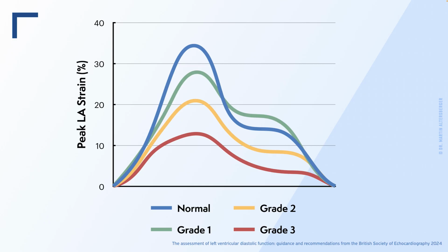So if the left atrial strain, the reservoir phase will be reduced, also the contraction phase will be reduced. The conduit strain for me has less relevant clinical meaning. So in my report, I mostly talk about the left atrial strain, reservoir phase and contraction phase.